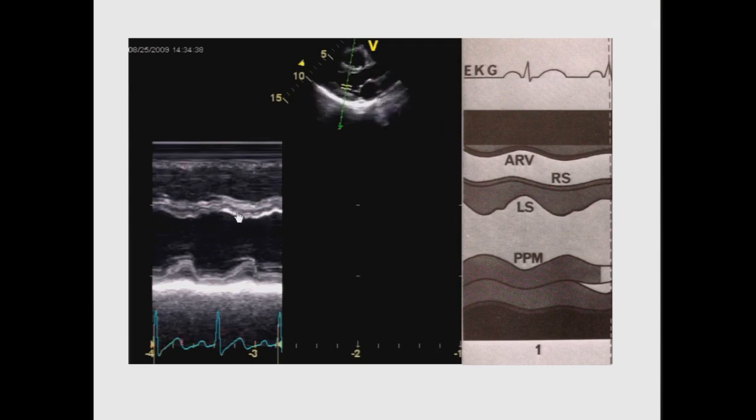And as Dr. Kronzen mentioned earlier, M-mode still remains a good way of diagnosing dyssynchrony, because in the normal individual the peak downward motion of the septum and the peak upward motion of the posterior wall basically occur at the same time. When you have left bundle branch block, that nice symmetric synchronous contraction of both of those walls is disordered, as I have an example of that coming up.